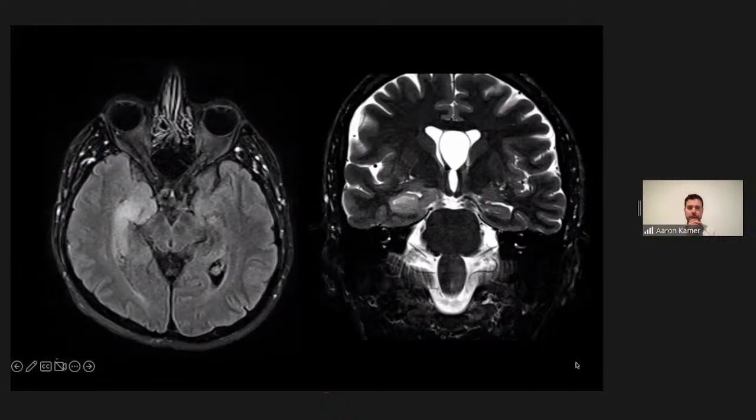All right. Let's see. Monali, can you tell me what you're noticing on these images? And by the way, we have trainees of all different levels and all different experience. Stephen, one of our fellows, actually participated with me in epilepsy conference last year, and Monali is a second year radiology resident. So yeah, a broad range of experience.